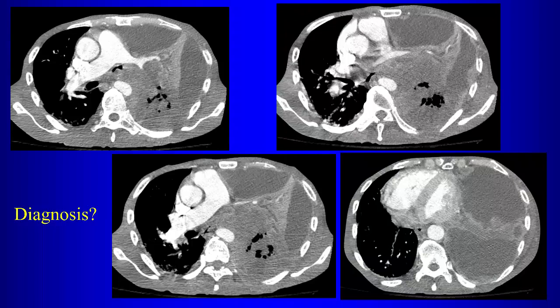Yeah. So how do you differentiate malignancy from empyema? What's different about the appearance of the pleura with empyema versus malignancy? Do you get pleural enhancement with malignancy? Well, if you have a malignant pleural effusion, what causes it? It's pleural metastases, right? So if you have a large pleural effusion and you're thinking malignancy, you're trying to differentiate pleural metastases from empyema. So how are you going to do that on the CT? What will you look for?